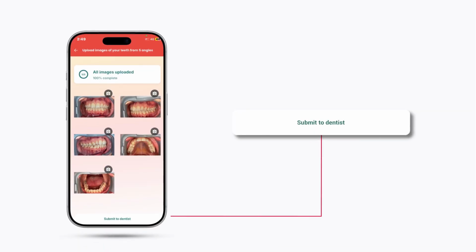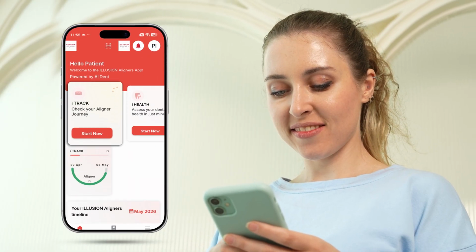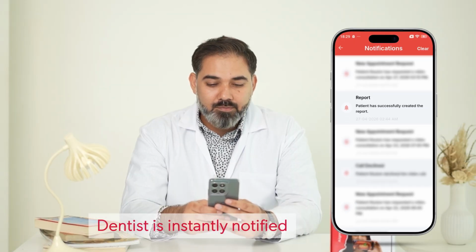And tap Submit. All the scans immediately reach the dentist in real time. It is as simple as this. In less than 1 to 2 minutes, the scan is done. Similarly, at each reminder, the patient must submit their scan. Once submitted, the dentist is instantly notified.